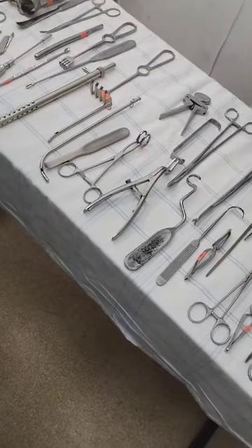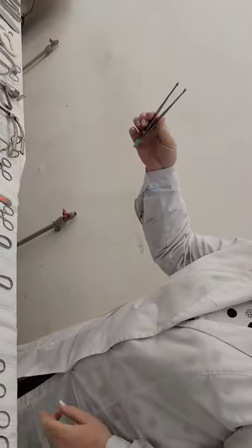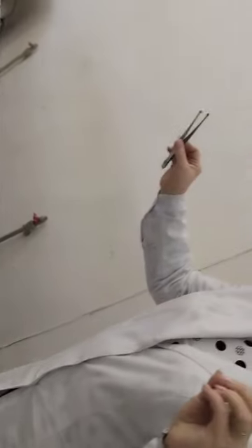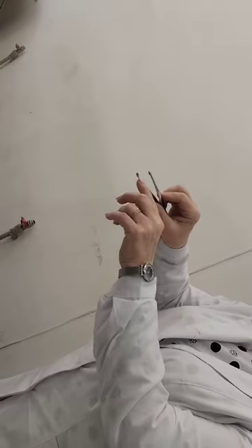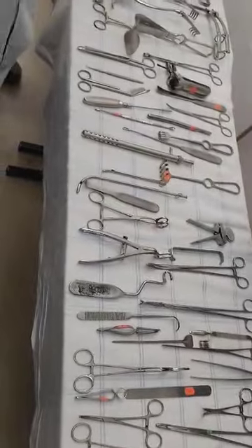Between the muscles. The next group, forceps, and I show you the forceps for the next practice. This is hand forceps. This one is fixated with 6 hooks on the ends. And anatomical forceps, and surgical forceps.